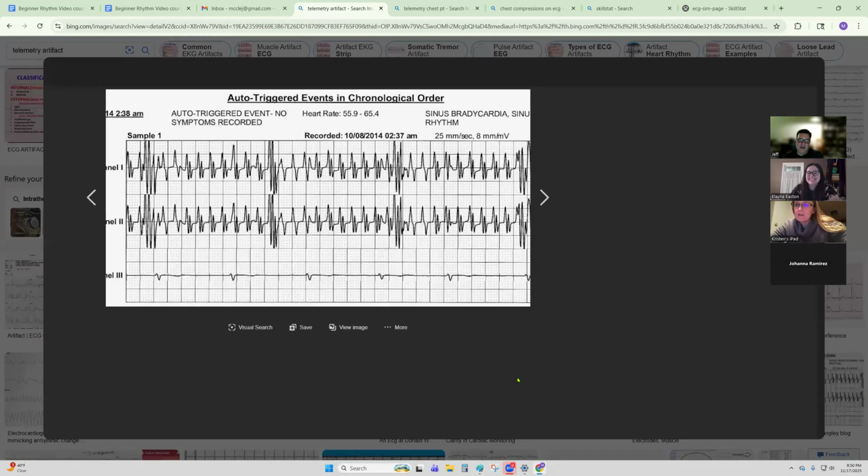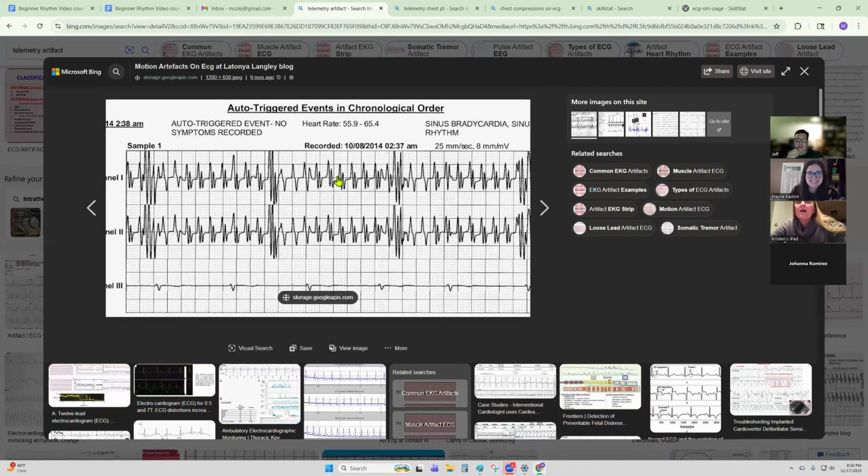So like this guy right here, this is a good example of the artifact, but you don't see it in all the leads, right? If you only see the top leads, like, oh my God, something's going on. But you open up all the leads and you're like, all right, it's fake, right? Yeah. And so would you call and say, please check the leads? It depends on how annoyed I was. If it's like alarming a bunch of junk, yes, I would actually get it fixed.